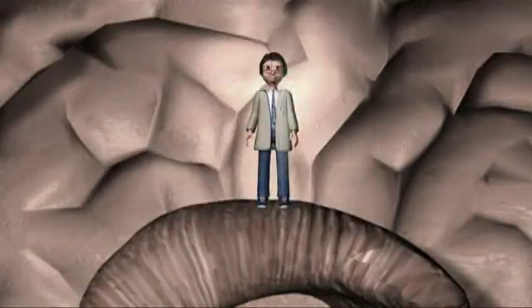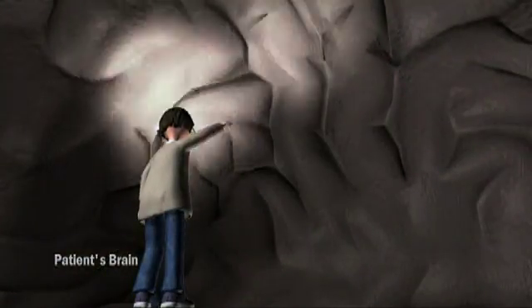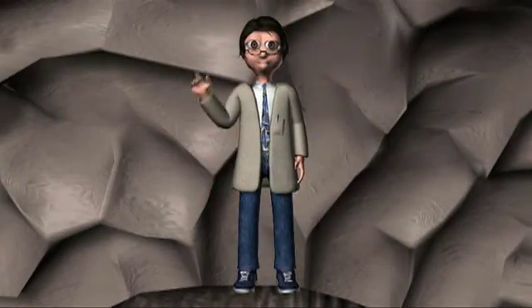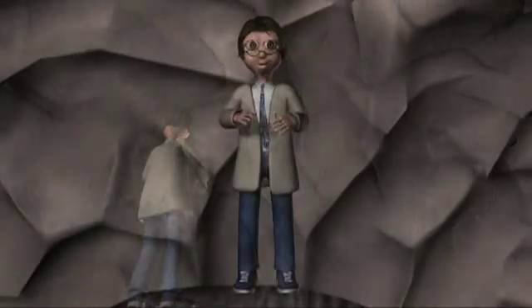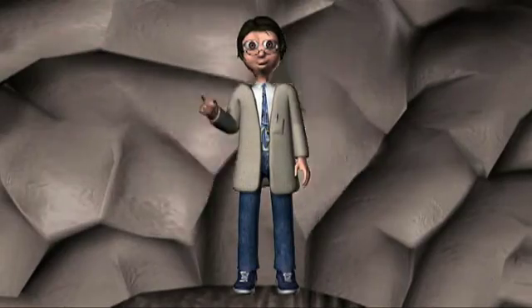Well, here we are inside the brain. Now look up there at the cortex. That's where the EEG gets its final shape. You can tell this patient's awake by how complicated all this activity looks. It's almost like a thunderstorm. And just like the weather, it changes. For example, during anesthesia.